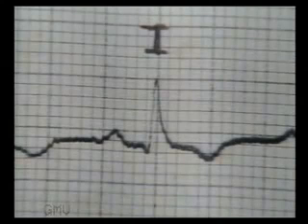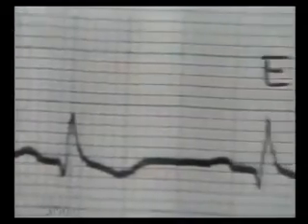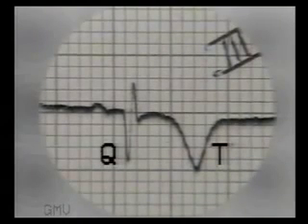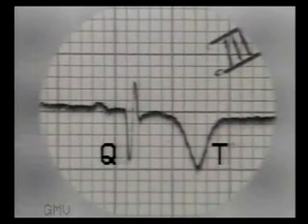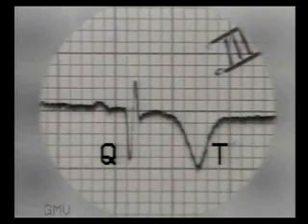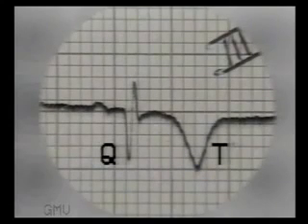Now see another tracing. No Q wave in inspiration, and note the appearance of Q wave during expiration. Lead 3 of this ECG shows deep Q wave, isoelectric ST segment and deeply inverted symmetrical arrowhead-like T wave of inferior wall myocardial infarction. This picture is seen between 3 weeks to 3 months. If ST segment elevation persists after 6 months, it suggests a development of ventricular aneurysm.